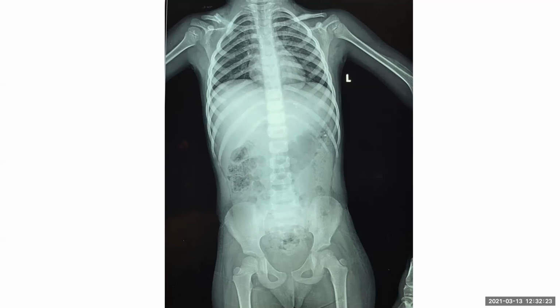Do you see any other basic bone abnormality in this patient? The rest of the bones appear quite normal. The ribs are slightly broad actually. No, it's a false positive finding, I believe. The bone density appears okay.